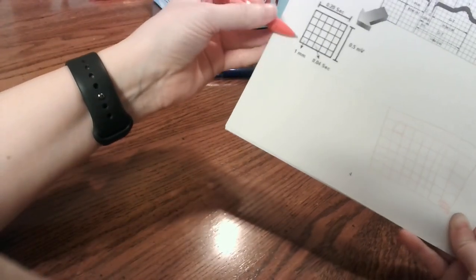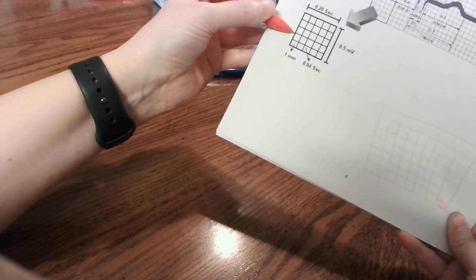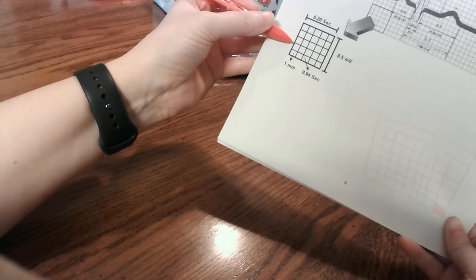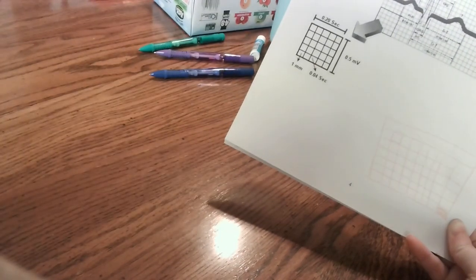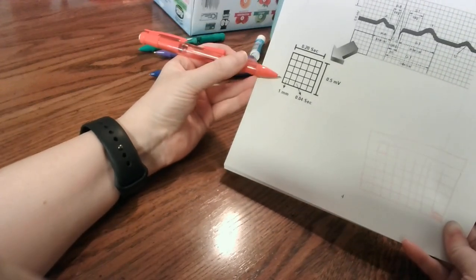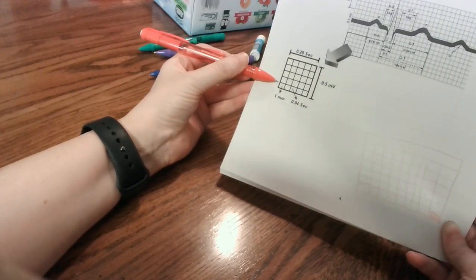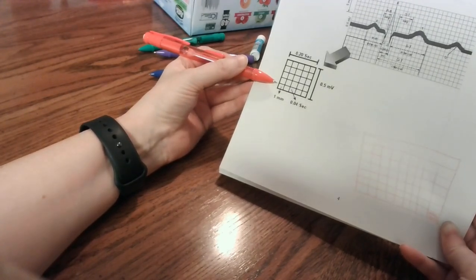When you're going up and down, each one of those little boxes is a millimeter, and that's mostly important whenever you're looking at elevation, because to have ST elevation for a STEMI, the elevation needs to be greater than 1 millimeter, and it needs to be in two consecutive areas, which I'll discuss in a few minutes.